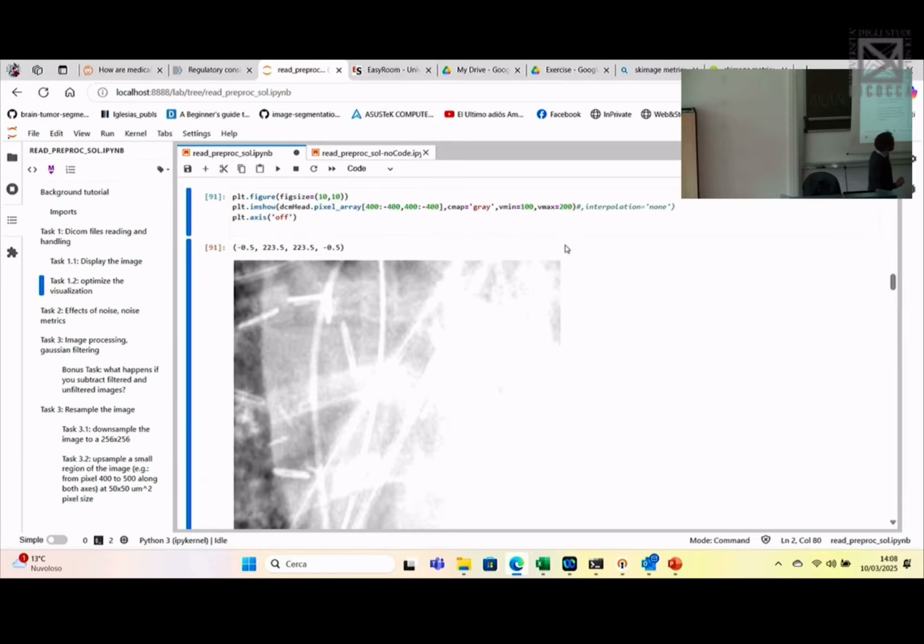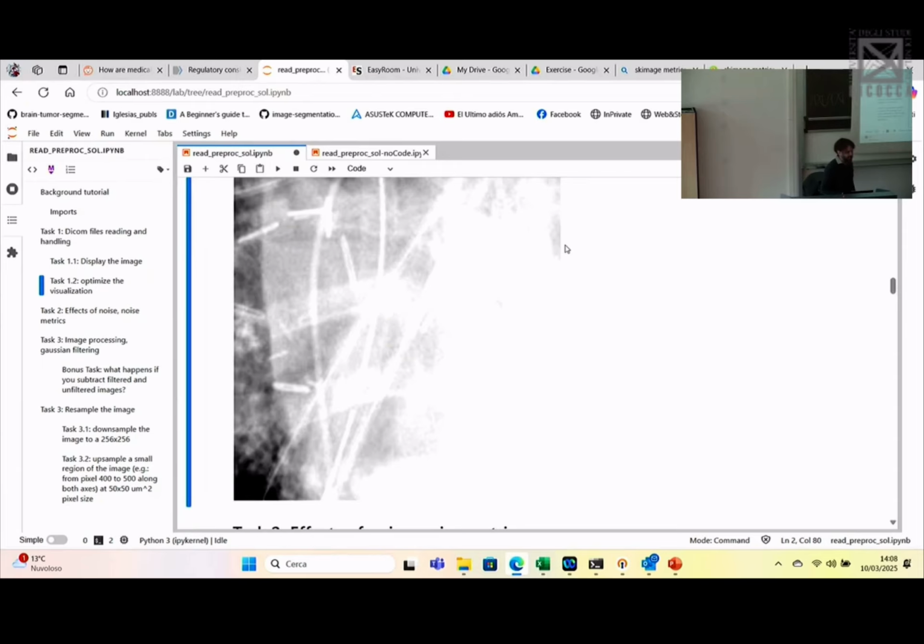You can see probably much better on your screen than on the beamer. But here, by selecting this very small range, you can see the ribs going over the heart, which you cannot see, at least not on our screens in this bright environment, when using the full image range. And these indeed are controls that the physician has. They can change contrast with just a touch of the mouse when reviewing them. Actually, reading them is the technical term.